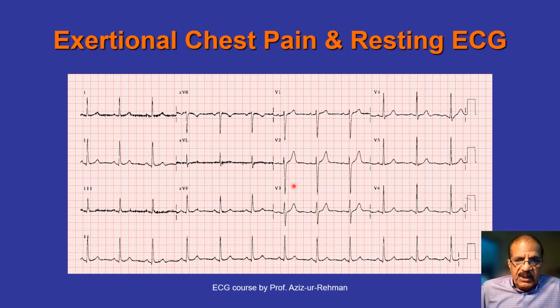This is another case. Imagine this patient gave you a very typical angina symptom, and that comes during exertion or whenever that patient is emotionally upset. Both can cause angina. Now look at this ECG.